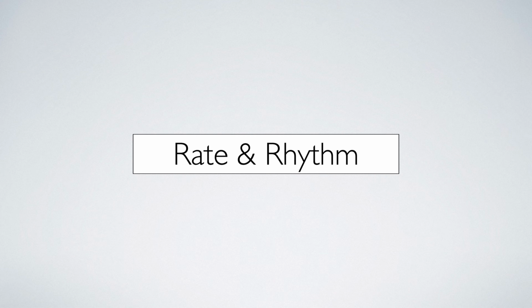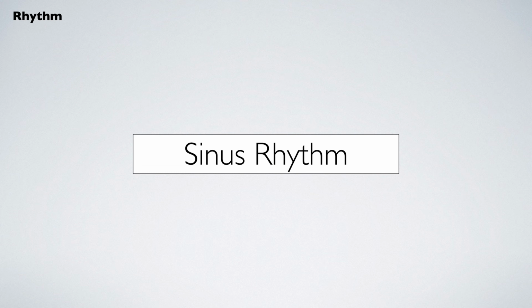Although I have presented the rate and rhythm as separate steps in the ECG interpretation, they are typically assessed simultaneously as part of your ECG assessment. Let's move on now to look at some other rhythms, starting with the most common of all, sinus rhythm.